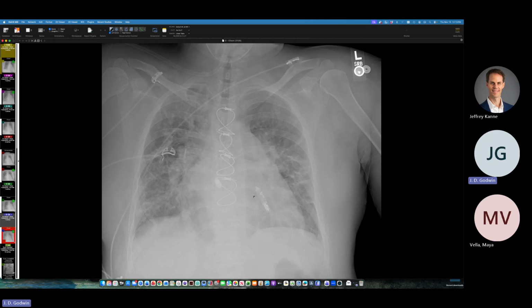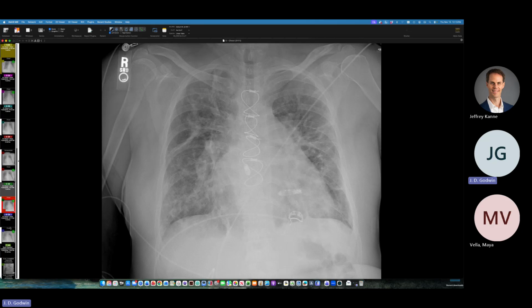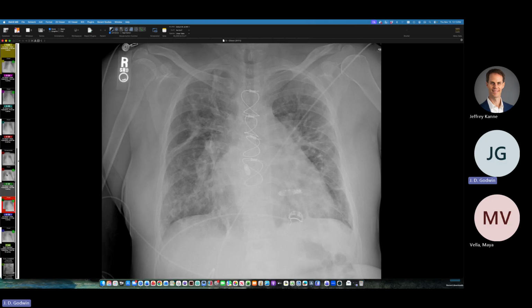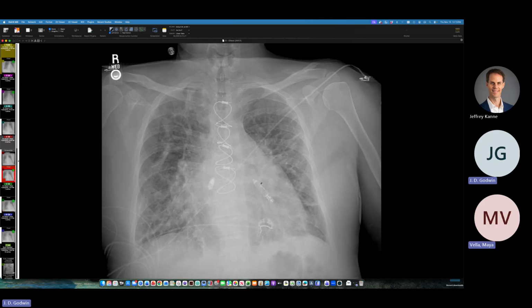The ventricular one seems to have changed orientation there. So here it was looking horizontal and now it's vertical. This is the attachment end here, this busy looking end with the more metal pieces. This is the little holder that they use to attach to the catheter or the wire that is inserting this thing. So this is the attachment end, and this is the end that embeds then in the ventricle. So this seems to be flopping around quite a bit. And here it is, appearing to be up there. The atrial one is steady.